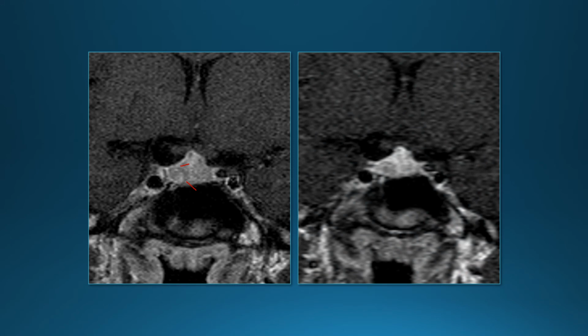So most of the time it's not that helpful. Occasionally we'll see a microadenoma a little bit better on the dynamic images. So this is one case. This is a delayed image, and you can see there is a microadenoma here on the right side of the gland, but it's kind of a subtle thing. On the early dynamic image, it's a little bit better defined. So sometimes the contrast between the normal pituitary gland and the adenoma is a little bit better on the dynamic images. The downside of the dynamic images is that the resolution is lower, because we do them pretty quickly.